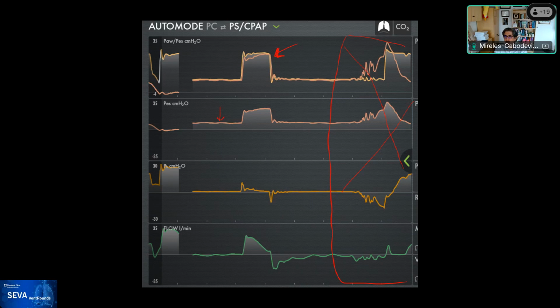Yeah, so I don't know who RJ is, but you're correct. Oh, Rutendo, good job. If the airway pressure mimics the esophageal pressure, i.e., they have the same pressures, which you can see right there, the same end expiratory pressure, the same airway pressure, the same profile, that is a patient that has the balloon gone the wrong way. So good job, Rutendo. You're absolutely right. It went into the airway.